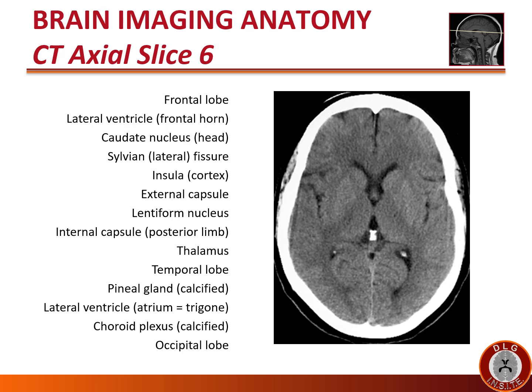Pause for a moment and see if you can identify the structures listed on this slide before proceeding. We continue to see the frontal lobe ventrally. We now see the black CSF space called the frontal horn of the lateral ventricle.